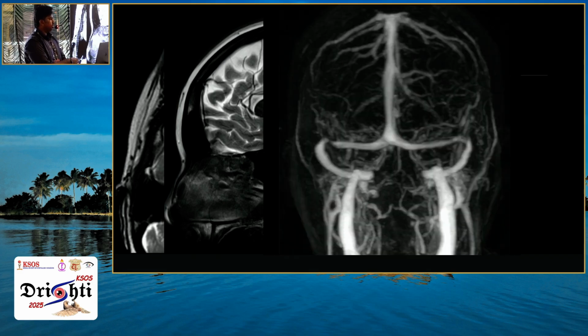And another, this is an image of MRV. In increased intracranial pressure, transverse sinuses are the most common ones to get stenosed, not because of thrombosis, but because of stenosis. But because of thrombosis also, idiopathic intracranial hypertension can occur. And in thrombosis, these white structures here are all the dural venous sinuses. In thrombosis, you will not be able to appreciate these sinuses based on the anatomical involvement.